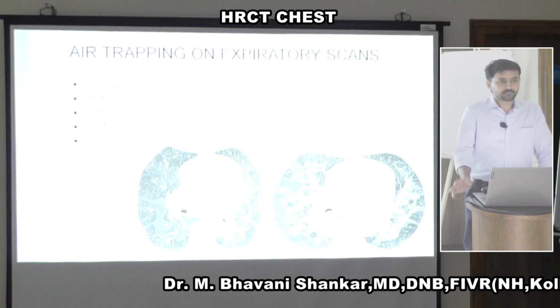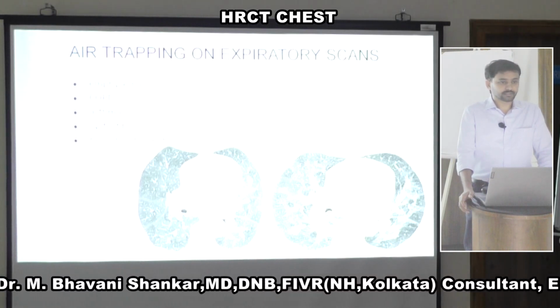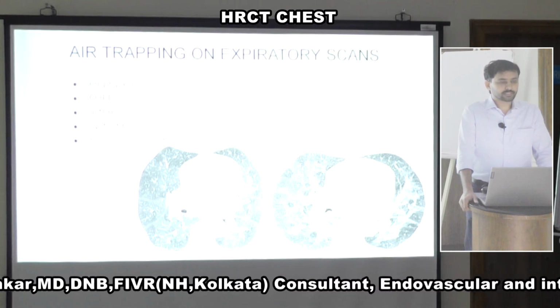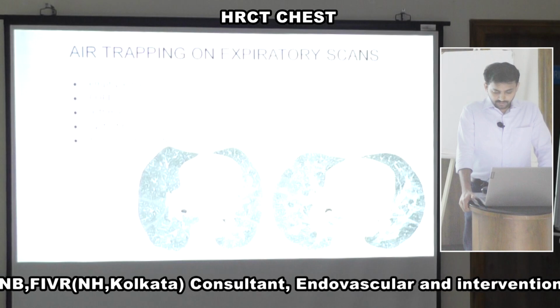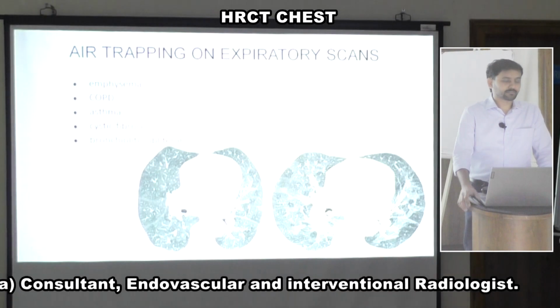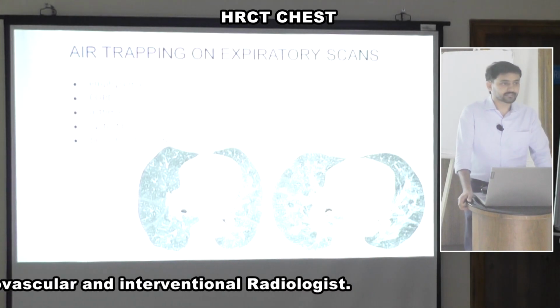Honeycombing patterns are relatively advanced disease, most commonly seen in interstitial lung diseases, bronchiectasis and emphysema. I think you can identify these easily on HRCT with this discussion.